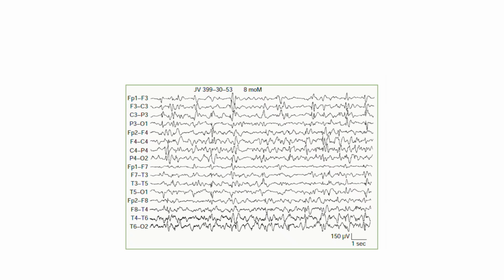1. Decoding hypsarrhythmia. The term literally translates to mountainous or high rhythm, and this tracing shows exactly why. We can break its features down into 3 main electrographic pillars: extreme voltage, high amplitude. Notice the calibration bar at the bottom right.